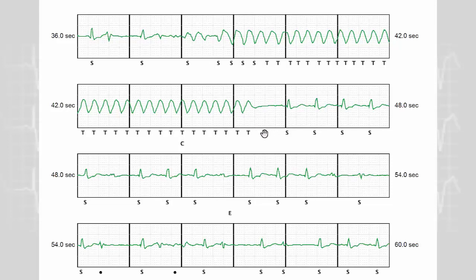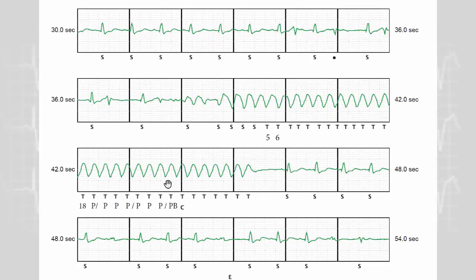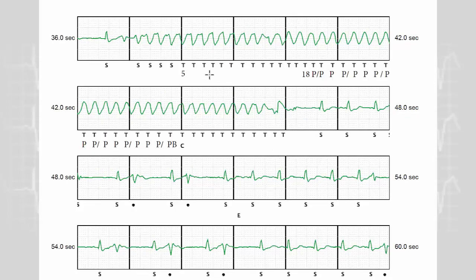Once more, it's a non-sustained arrhythmia with charge of the capacitors, but no therapy delivered. And you will see that since there have been previously 2 episodes of charge without delivery of the shocks, you will require 3 additional cycles. So since there have been 2 previous episodes of non-sustainability with charge of the capacitors, the device will add first 3 and then 3 additional beats, so 6 additional beats before the processing beat and then the charge of the capacitors. So in these patients there were many episodes like this with non-sustained arrhythmia but with charge of the capacitor.